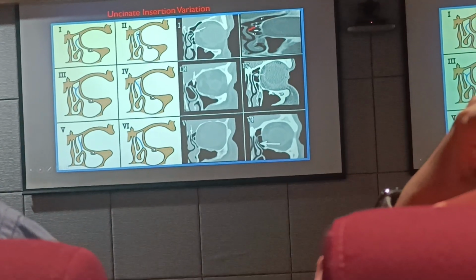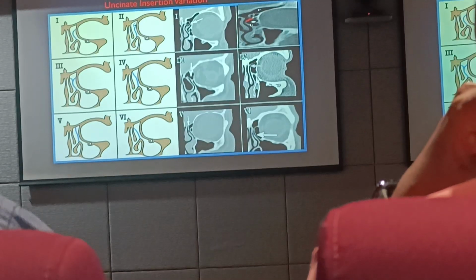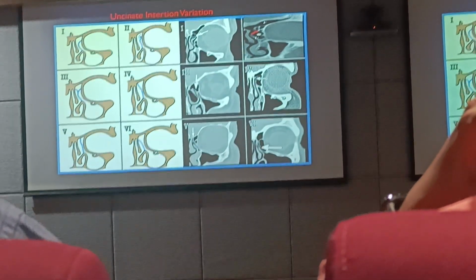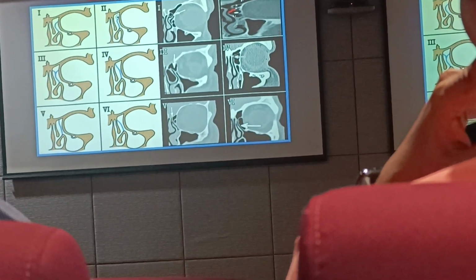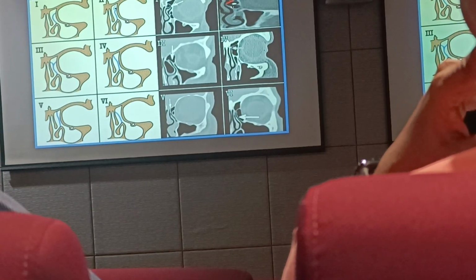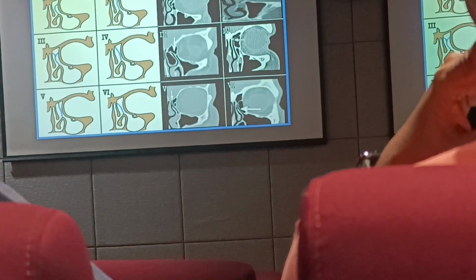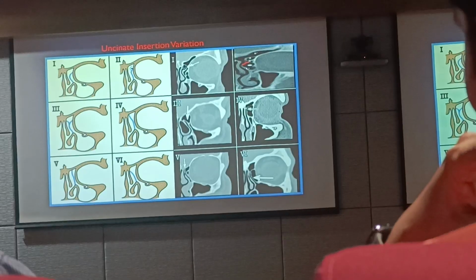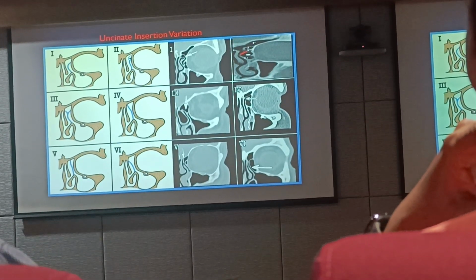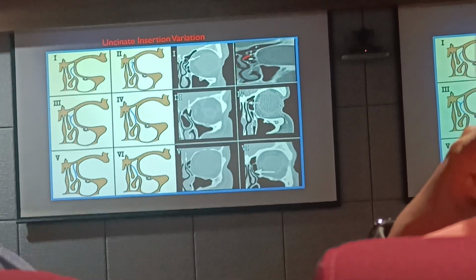Lateral to your uncinate. So the uncinate needs to come out, and when you take off the uncinate, you need to take it off right till the top. Many people take out the lower half and leave the attachment to the upper half. You have to remove the upper half and the lower completely, and lateral to your uncinate is going to be the orbit. That's why they say go with a retrograde method to bite the uncinate and take it out. Don't go forward. If you take a sickle knife and cut the uncinate, I think Sujata may show you that, you're likely to enter into the orbit.